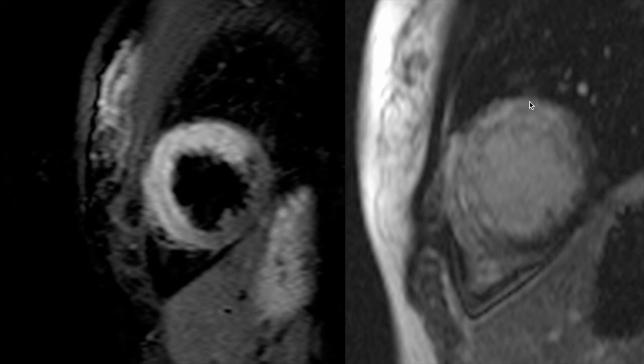But it is very important to understand here that in scenarios of acute myocardial infarction, the degree of edema will lead to overcalling of the transmurality of the infarction, and hence in these scenarios it is useful to add low dose dobutamine to the viability assessment protocol.